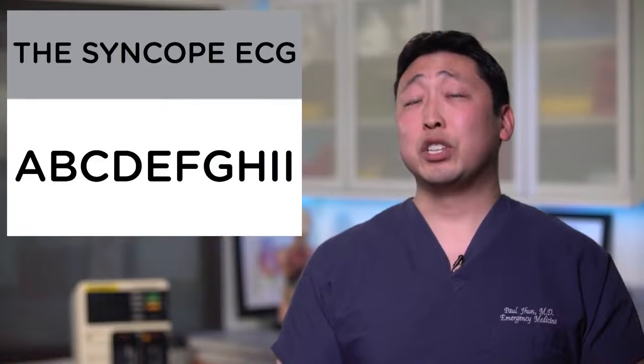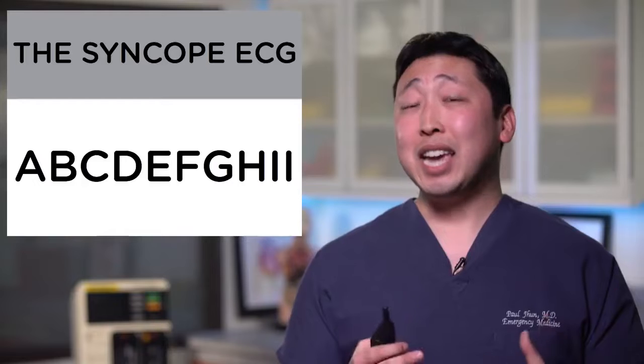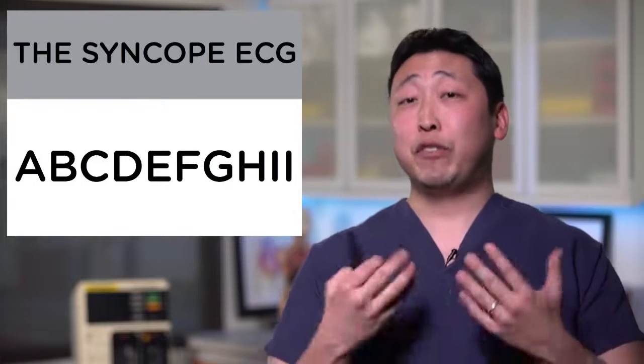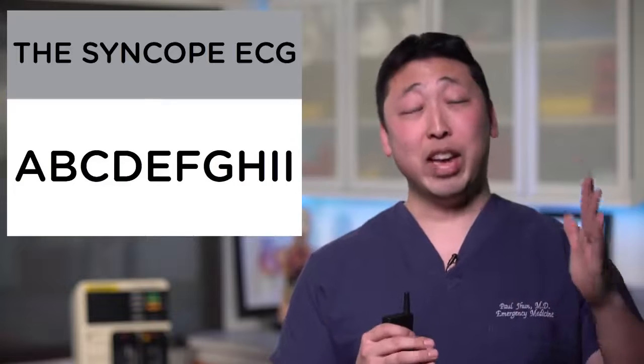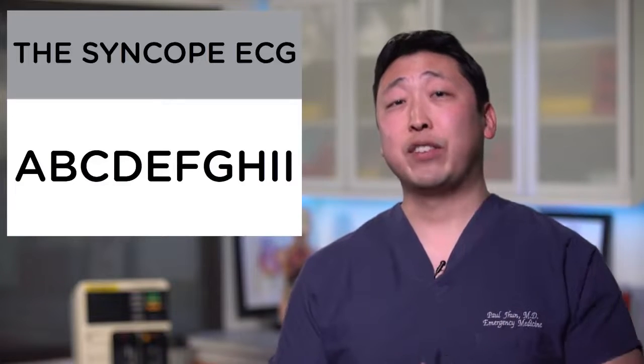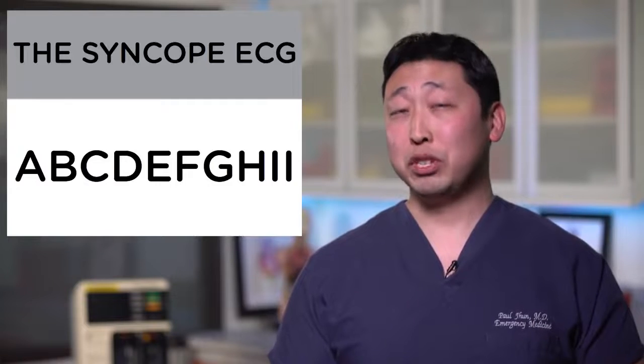The last I is for ischemia, right? So in the setting of ischemia, your heart might be dying and it's not pumping very well, so you're not perfusing your brain. And that wraps up the entire systematic way to look for all the electrocardiographic red flags the next time you see a patient presenting with syncope or presyncope.